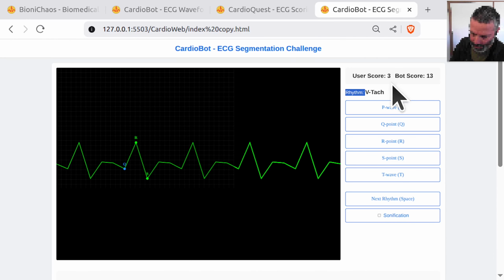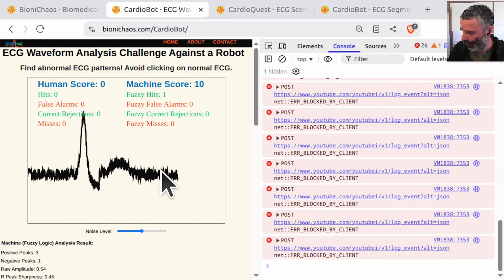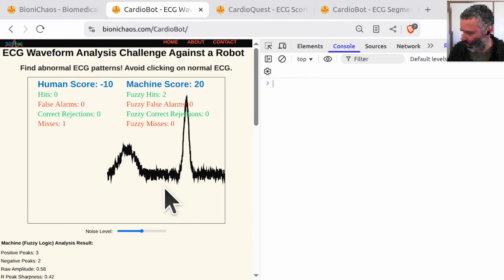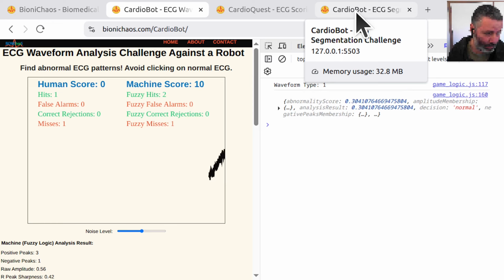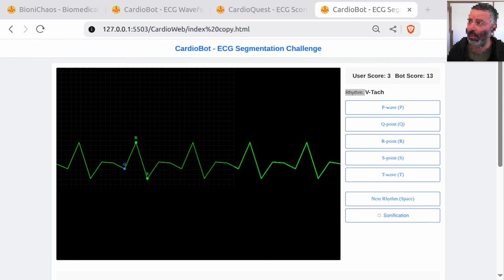Okay, I was able to gain another 2 points labeling R and S. That's not exactly what I had in mind. The original thing is quite different. So the bot hallucinated on us. So I have to come back to it at a later stage.